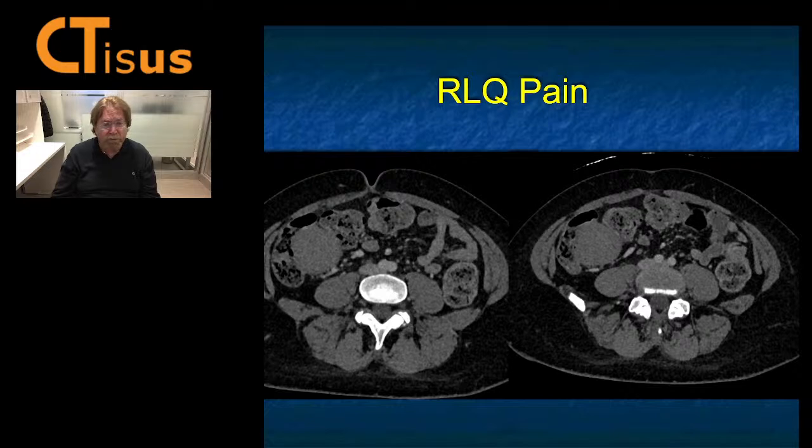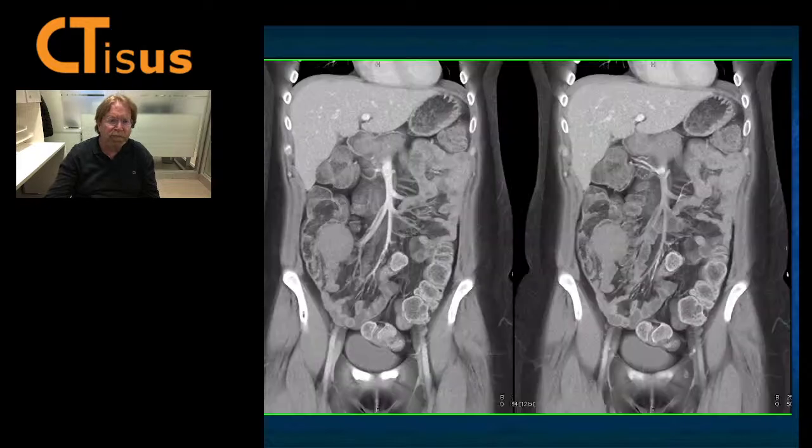It could be a GIST tumor, perhaps. You also always think about lymphoma. Carcinoids are thought, but carcinoids are usually vascular. Now, what else could I be thinking about? And let me look at the coronal image. You can see very nicely the mass here. You could think about, could this be adenopathy like lymphoma? Doesn't look like a Crohn's or inflammatory. It looks like a soft tissue tumor. Could be an implant. It's not vascular. You could think of Castleman's disease, but that's more in the mesentery.